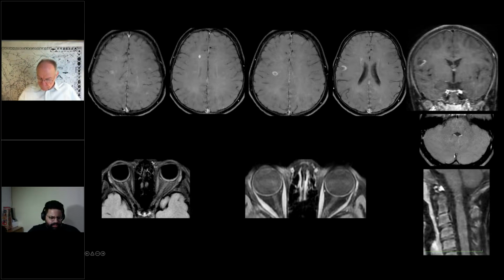These are the non-contrast images of the orbit and optic pathway. No edematous changes are demonstrated, and post-contrast, I could not appreciate any enhancement. Probably there is some mild degree, but it is not clearly evident. On the post-contrast sagittal, I'm not sure if these are enhancing foci. We don't have an axial, so I can't say if these are two lesions or not.